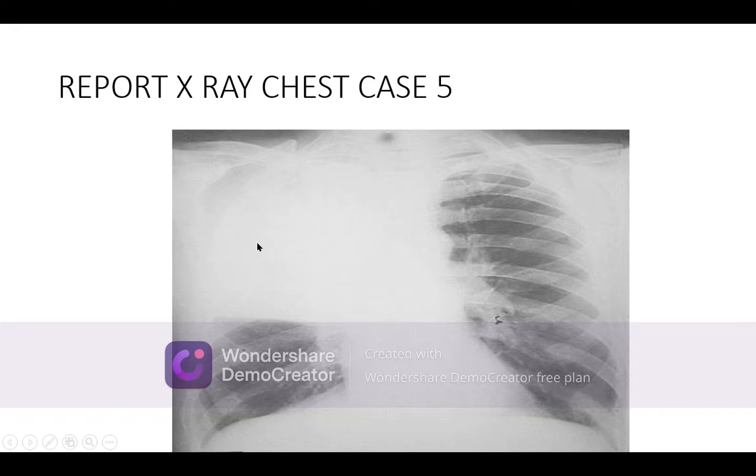So the differential diagnosis is definitely wide. Otherwise, all other parameters are normal. The differential diagnosis already said: acute inflammation or the result of acute inflammation, chronic inflammation or the result of chronic inflammation, tumor and tumor-like states and their complications, and miscellaneous conditions like allergic conditions, pneumoconiosis, parasitic infestation, and autoimmune diseases. All can cause this opacity, remember. All can cause a single, homogeneous opacity.